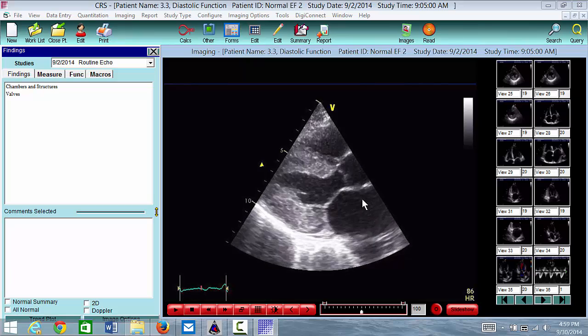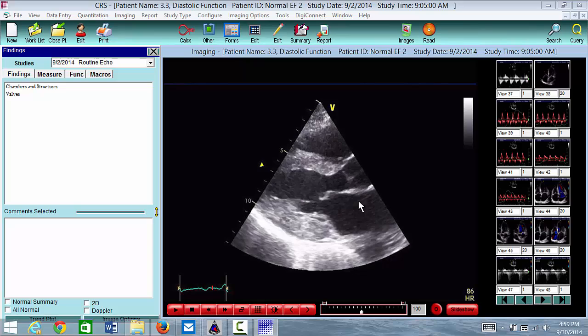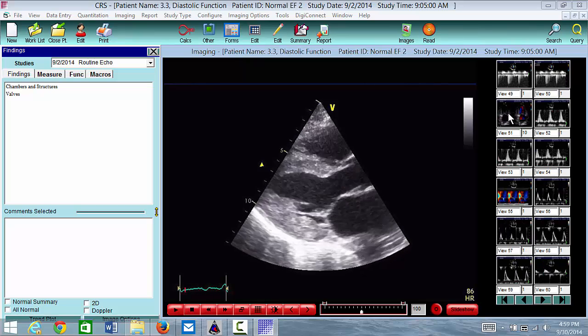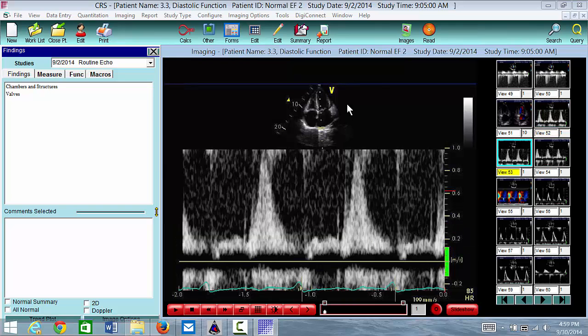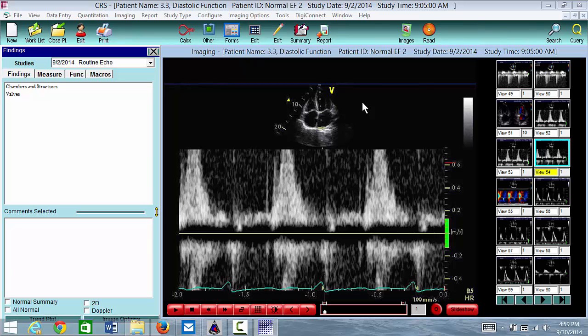The study does have some sort of what not to do, I guess I would say. So these are the pulmonary veins, right? So not the greatest. Again, they could have reduced the reject here on the baseline. So again, if you wanted to illustrate sort of what not to do, this is not the greatest.